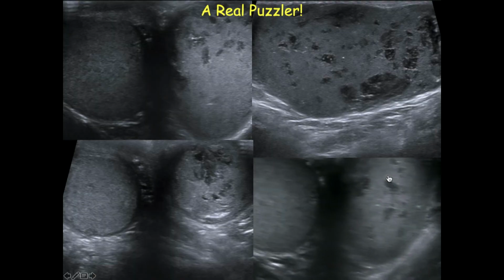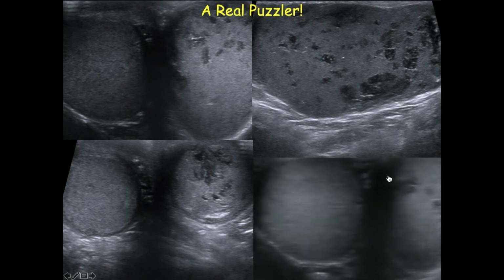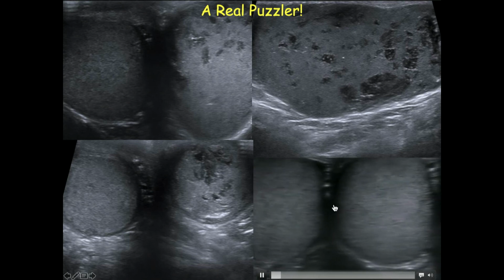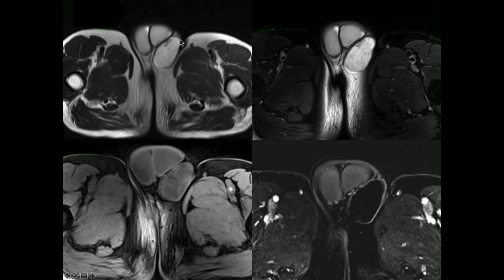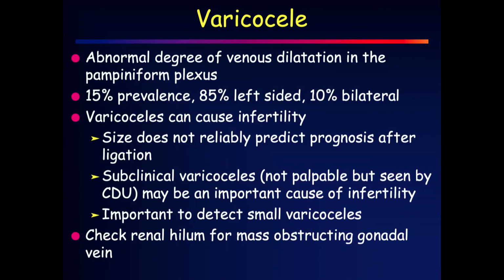Here's another case where I was 100% sure that we had polyorchidism with a mixed germ cell tumor in the third testicle. You can see two testicles right here, look totally happy, and then what looks like a mixed germ cell tumor there. We got the MR, and on T1 and T2, it was nearly iso-intense to the other two testicles, but when we gave GAD, it didn't enhance at all, and this turned out to be a pseudotesticle or an epidermal inclusion cyst in the scrotal wall. And once you see one of them, you start seeing them again and again.